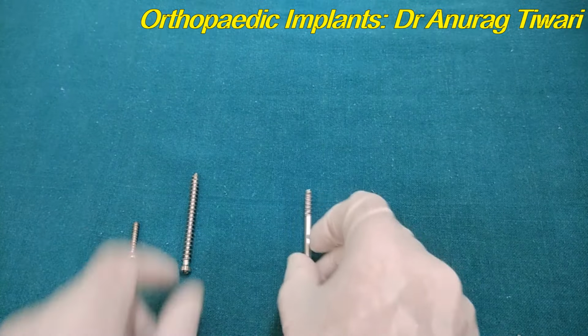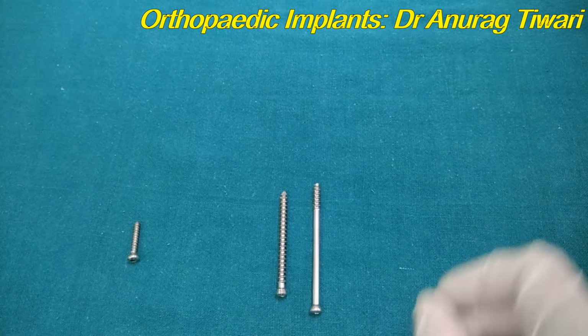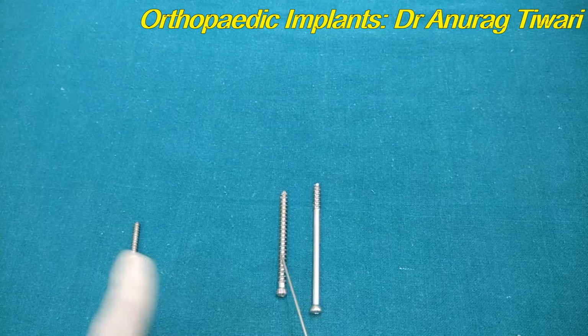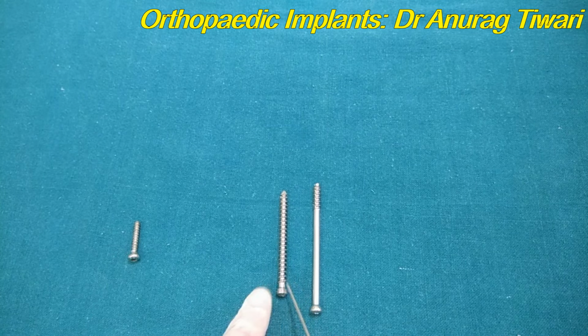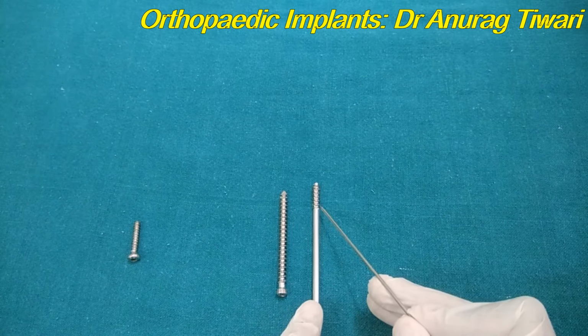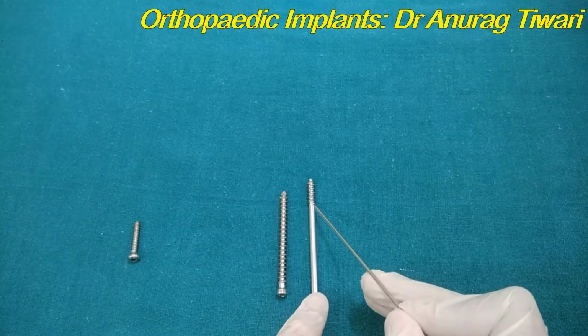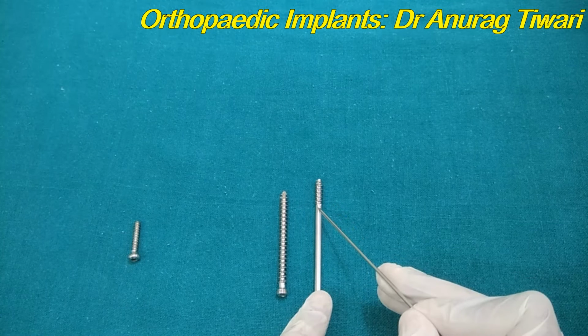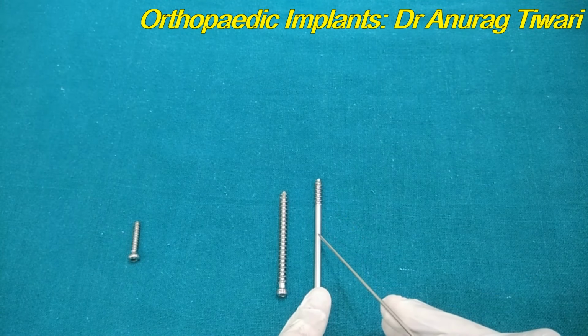Another is that it could be fully threaded or partially threaded. You can see here that these screws are fully threaded, that they have the threads throughout the length, whereas this one is partially threaded, with the thread only at the tip. Now they can be of two types. There could be a 16 mm thread length or a 32 mm thread length.